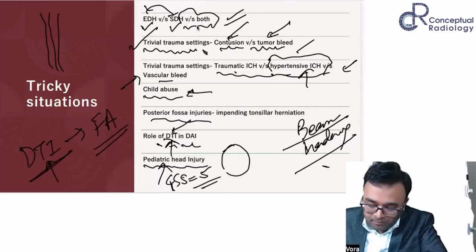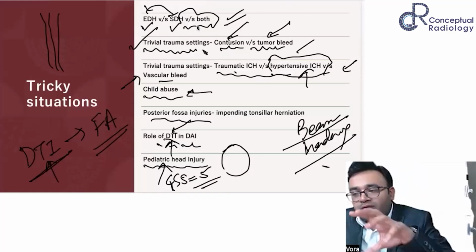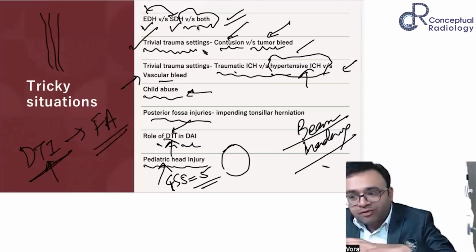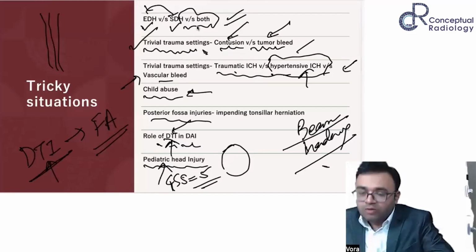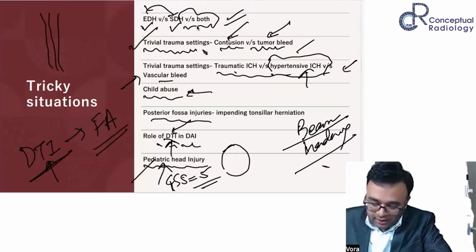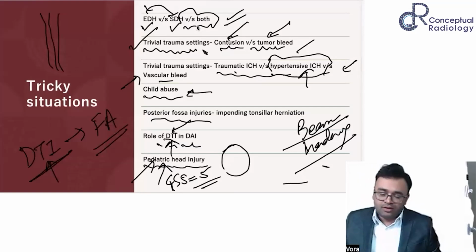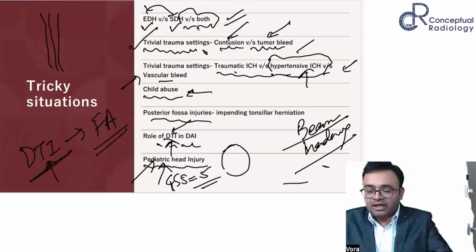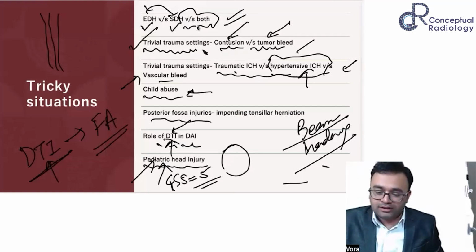This is very, very important, because in the CT head of a child, the brain is very grainy. It is very difficult to distinguish a subdural hematoma or a developing infarct. It is grainy because it is very robust, very full. It is not like an adult brain. So be very careful. Change the window to the subdural window, as Annabeth told you, and be especially careful looking at the cisterns in a pediatric head injury. This is what I, as a neurosurgeon, would request all radiologists to follow in their setup. I'm sure the rest you will learn as you practice along, because it's everyday practice.